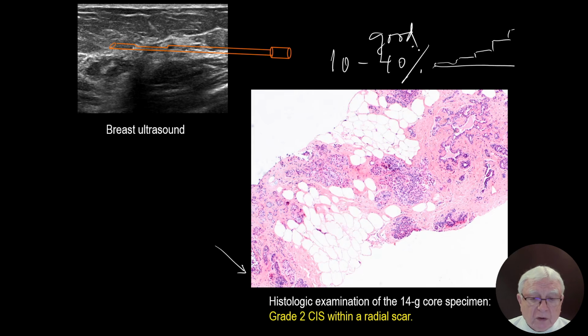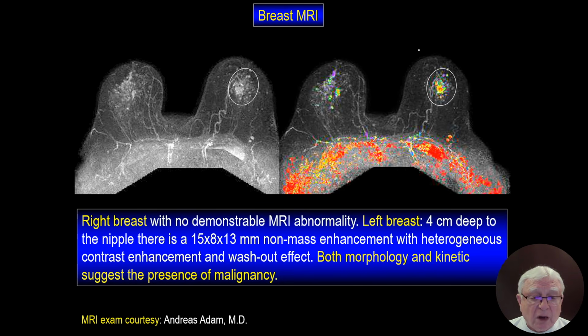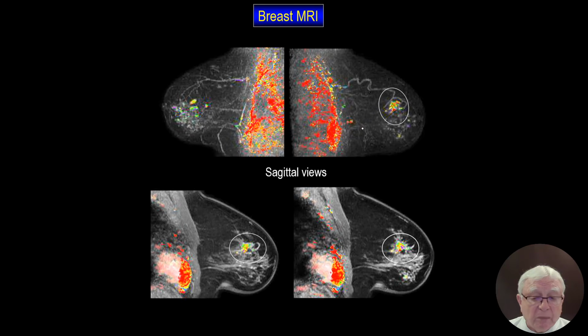That is grade 2 cancer in situ associated with radial scar. No wonder this showed the active radial scar. And this was interpreted as physiologic changes. Very tough. Your other MIP images, the MR doesn't help you in a diagnosis. It helps you in determining the extent, or guessing the extent. It shows that it has a radiating structure.